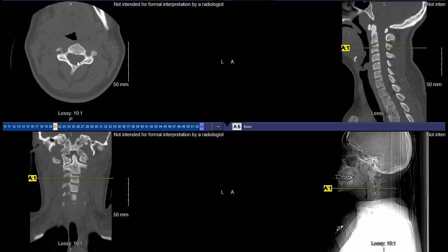Just looking at some of the other structures, I think this is a pretty good slice because it shows an aspect of the pedicle right there and right there before it transitions right now into the intervertebral foramina. So you can see that foramina would be actually located there and there respectively on both sides. So really a great transitional image there through the pedicles. Respectively, then you also can see the area of the lamina on both sides of the spinous process in between the regions of that transverse process.